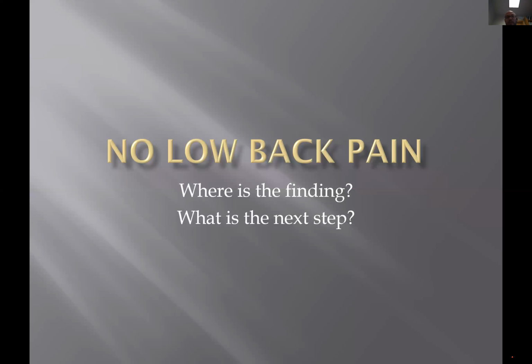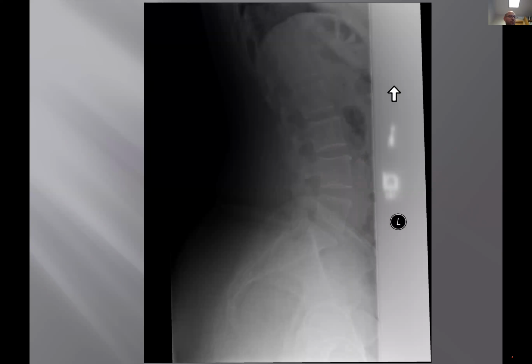Next case, no low back pain. Okay, this is a detection question. Just make the finding for me. What level is the abnormality here? L3. Yeah, I agree. Nice work. L3 would be your detection.